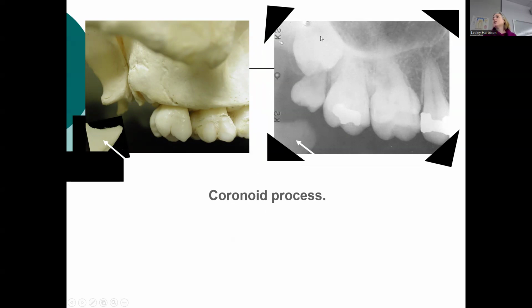Extra teeth. They got extra. Do you see that? They got their first and second molar, they got a wisdom tooth, and then they got another wisdom tooth. They got extra teeth.